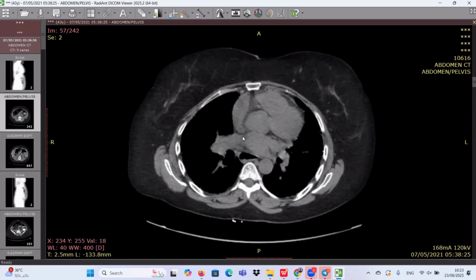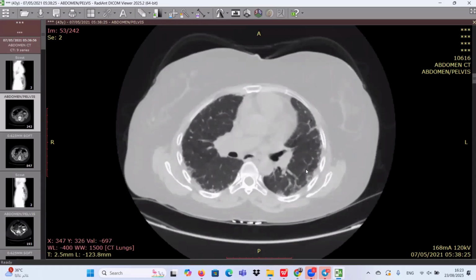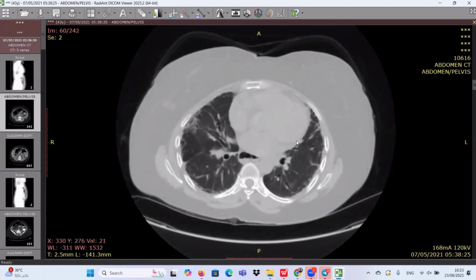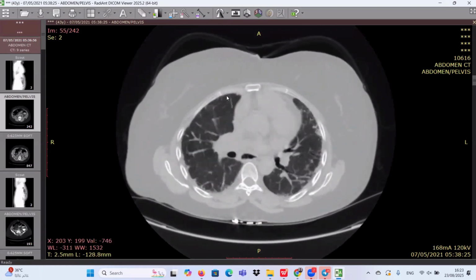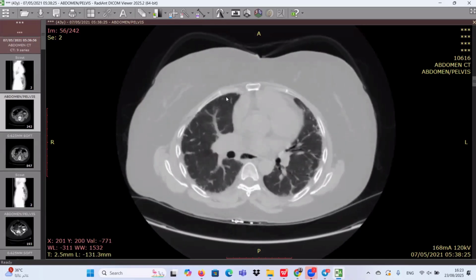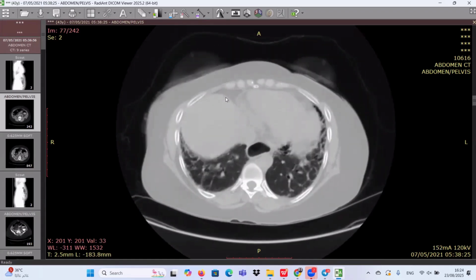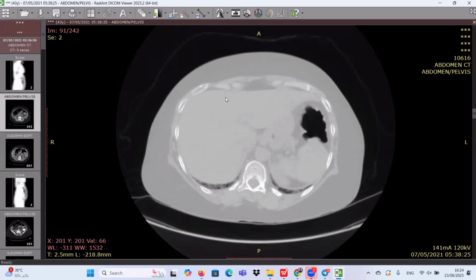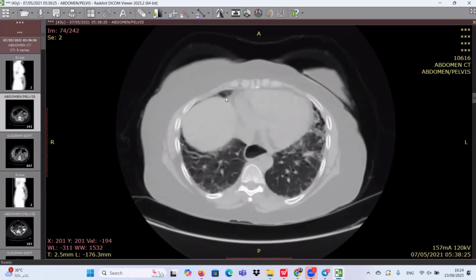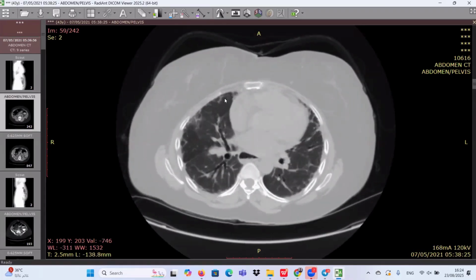Okay. Let's go to the lung window. This is the lung window. In the lung window, I can appreciate changes of septal thickening with classical subpleural sparing, and subpleural fibrotic changes are noted with a few intervening areas of ground glass haze. So this is likely an interstitial lung disease pattern, NSIP, with patulous esophagus, which is concerning for scleroderma in this case. Very nice. Let's conclude.